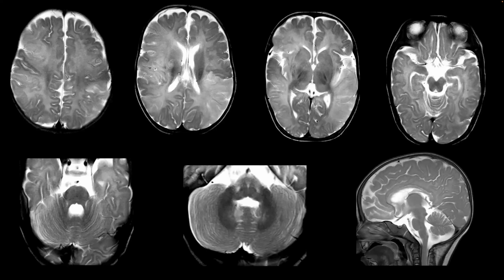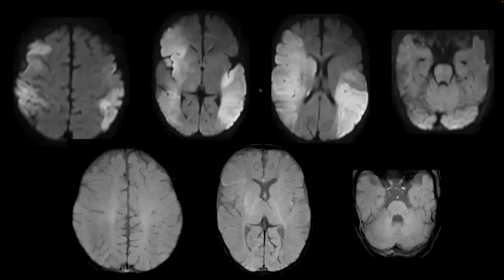There is also some degree of volume loss, particularly in the cerebellum. You can see that the folia are slightly more prominent. The corpus callosum also demonstrates these hyperintense changes. On the diffusion-weighted sequences, we have restricted diffusion, again slightly asymmetrical, in the frontal lobe, perisylvian regions, and temporal lobes, predominantly the left temporal lobe, with an almost wedge-shaped appearance on the left side. The caudate nucleus also demonstrates restricted diffusion. There are no hemorrhagic components and no calcification.